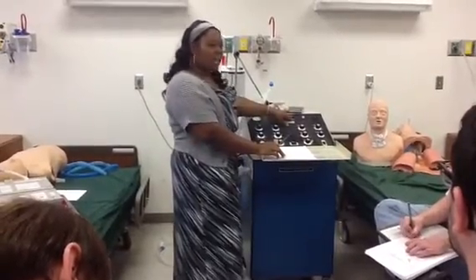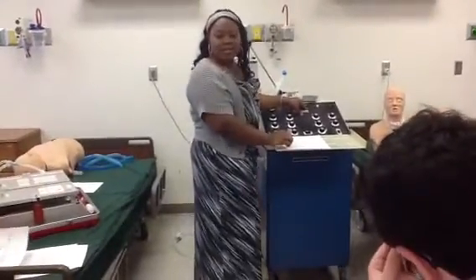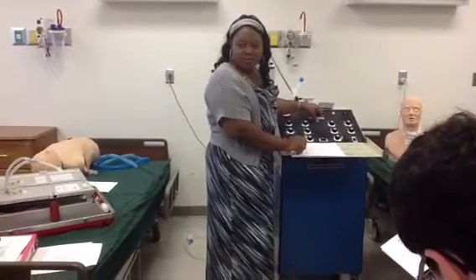So what controls how fast or slow that breath is going in? Expiration? Fast or slow? A breath is a flow. Peak flow. So you said this is peak flow, which controls how fast or slow your patient's breath is going in. If you increase peak flow, then your inspiration is going to go in faster and you will have more time to exhale. Right? Makes sense? It makes sense. Yeah, it makes sense.